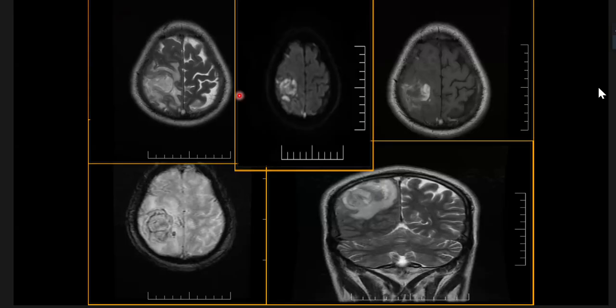As per the intensities, if it was blood, which stage of blood is it? Subacute. Very good. It is bright on T1 and heterogeneously hypo on T2, so probably in a subacute stage if it is blood. So you have come to the conclusion that it is subacute blood. Now you have to find out the cause of it. How are you going to find the cause of it?